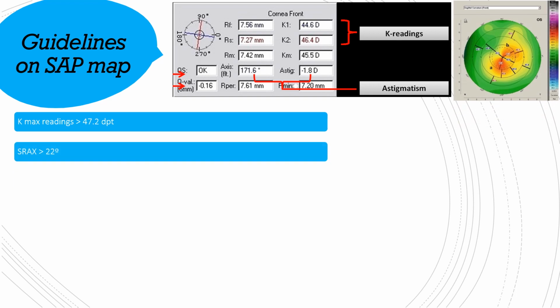Then is the SRAX. Look at the bow ties. This prong of the bow tie is in this direction. The other one should have been straight to it, but this one is actually like this. So the angle between the two is more than 22 degrees. So this means the SRAX is more than 22, which is an abnormal or suspicious finding.